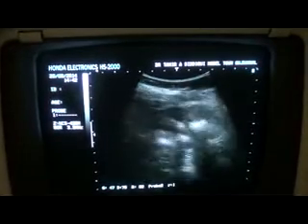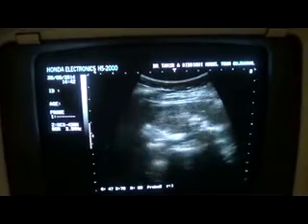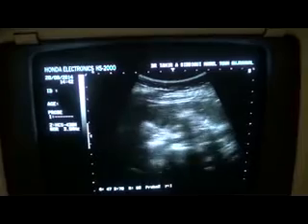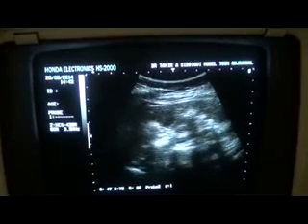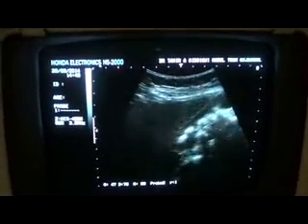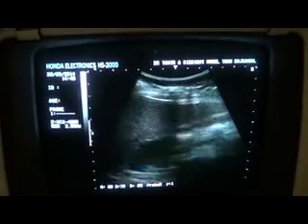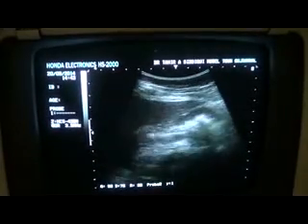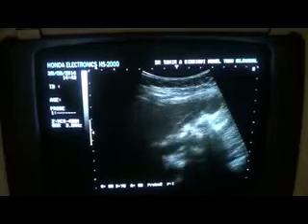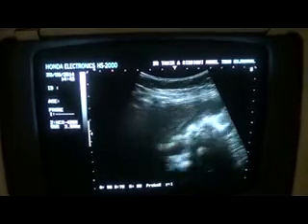And the reason why this patient has no other complaint, no vomiting, no weight loss, no anemia, is that the corticomedullary differentiation is intact. If we compare the echogenicity of the kidney with the adjacent liver, then the echogenicity of the parenchyma is less as compared to the adjacent parenchyma, which is normal.